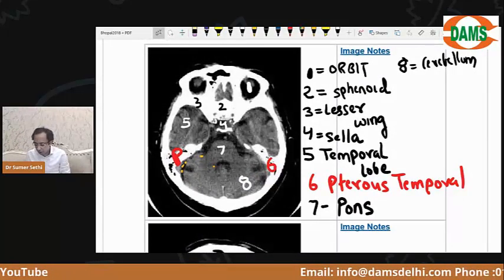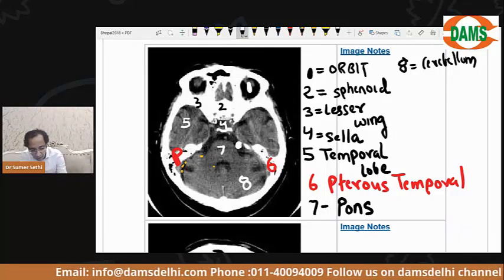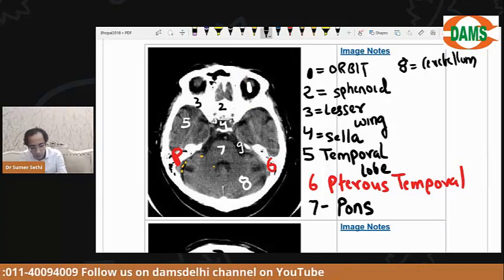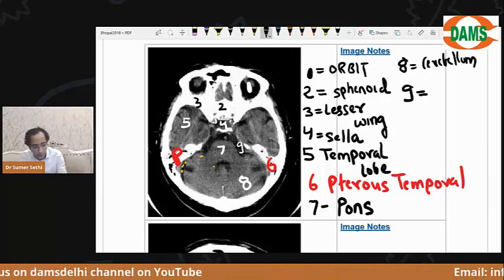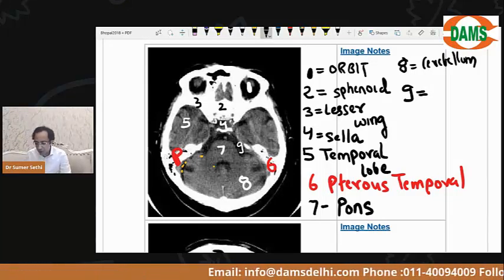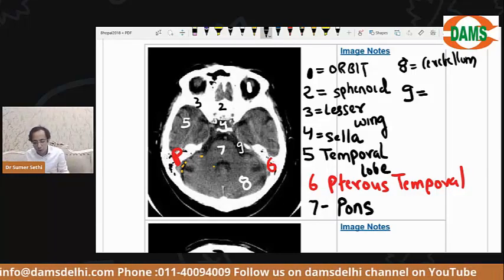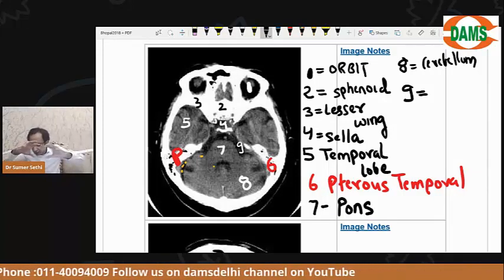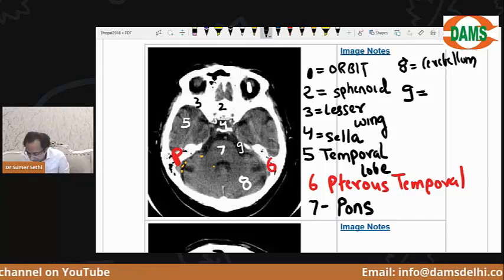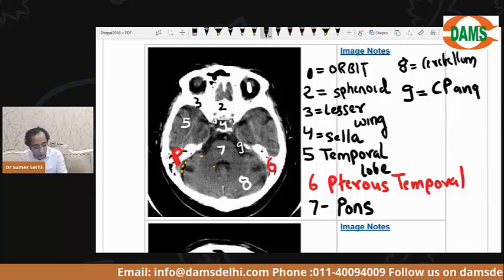Okay. So once you understand all this, I will ask you to identify the structure that I'm labeling as number 9. What is the structure labeled as number 9? Sheikh Mohammed, I hope you see why this is not the cerebellum. Please see the drawing that I have made, where I explained that the foliar architecture is there. The entire shape is like that of a cerebellum. Now please see number 9. Number 9 is the area which is called the CP angle.